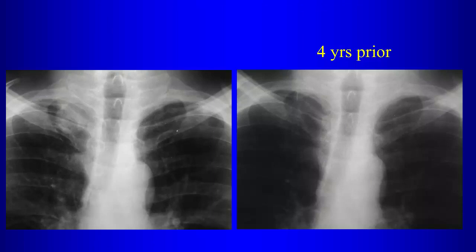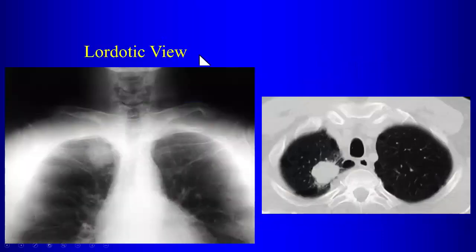So what tends to happen, in my experience, is not so much that I look here and then I look here and, ooh, there's something here, but that while I'm reviewing the chest radiograph, gee, there's something that looks a little bit different over here than it does over here. And now you go back to the prior study and you look, wow, this really looks very different than the way it did before, right? So now your index of suspicion is a lot higher that what you're dealing with here is a real abnormality. So using those prior films is very helpful.